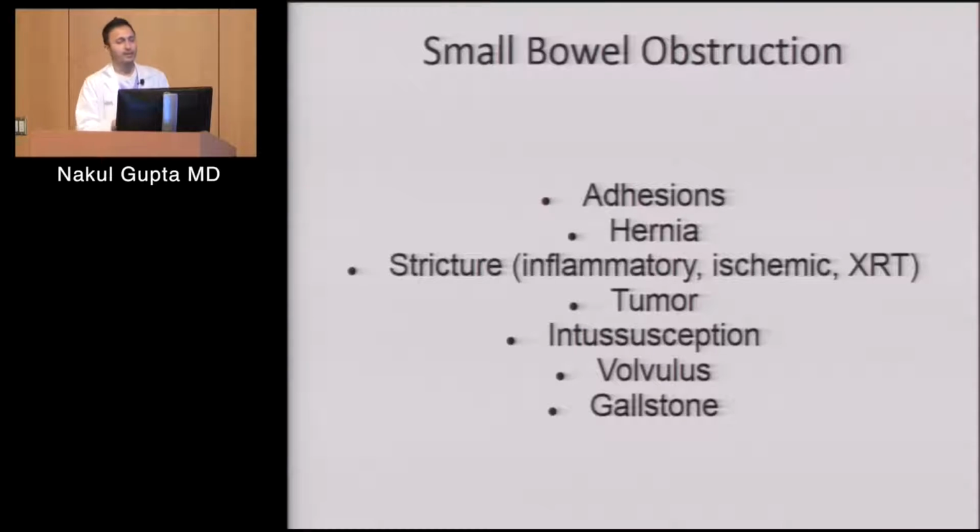Another thing you'll see strictures or obstructions from is tumor. This is most commonly in patients who have peritoneal carcinomatosis from either pancreatic cancer or some other GI cancer, or from a pelvic cancer in women like endometrial or ovarian cancer. A lot of times they'll get peritoneal carcinomatosis, where you get tumor involving your mesentery, and you'll get tumor deposits on the small bowel serosa, and that'll lead to stricturing and extrinsic compression and basically obstructions.